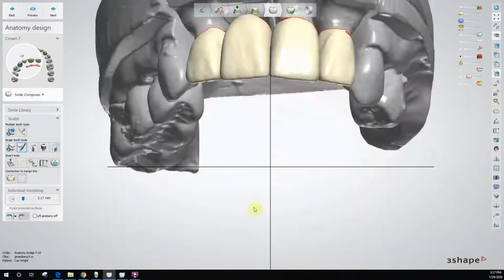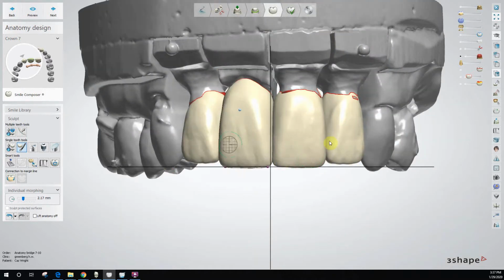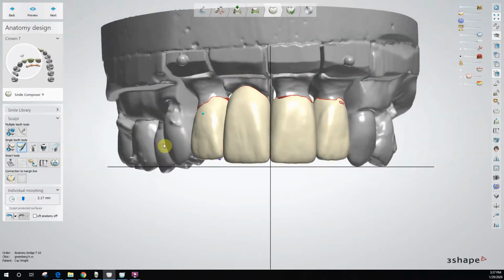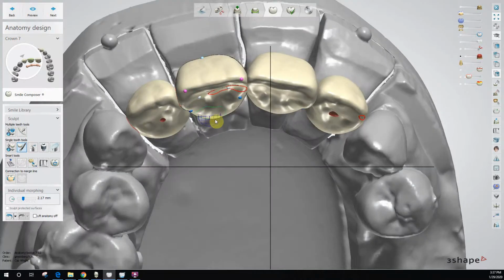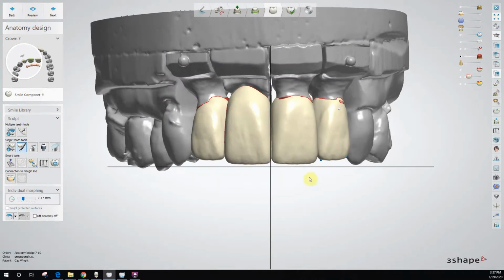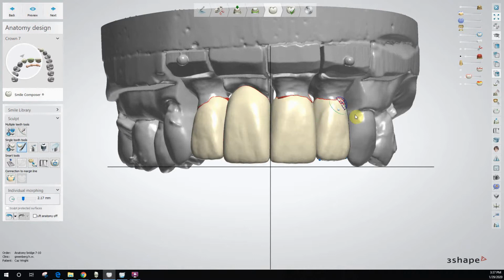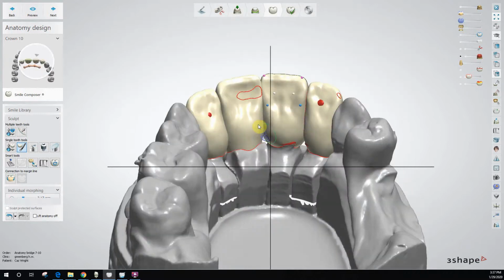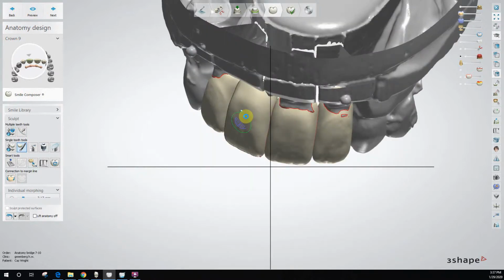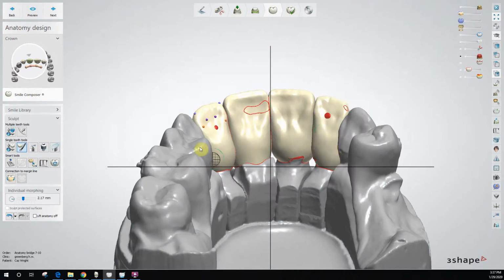But when you're first getting going, I really like to set my teeth placement, my widths, and my incisal embrasures all at the same time first. Once that's done, I copy to the mirror tool, and I shift and grow and all that stuff at the same time, and really keep that uniformity. And then once I get my incisal edges exactly where I want them, my lengths, widths, and all that kind of stuff, then we'll start worrying about the margin, the linguals, that kind of stuff. As long as it looks good here, everything else can be faked down here and faked from the lingual.